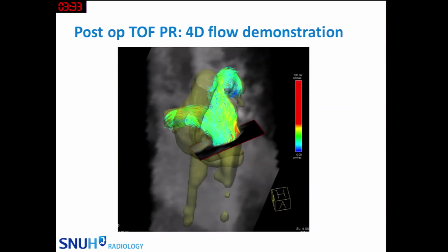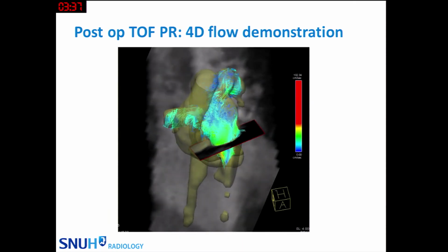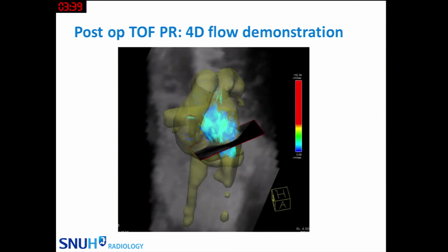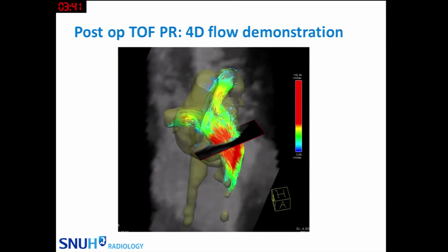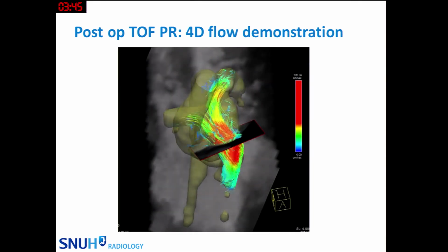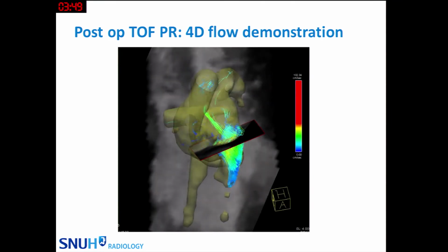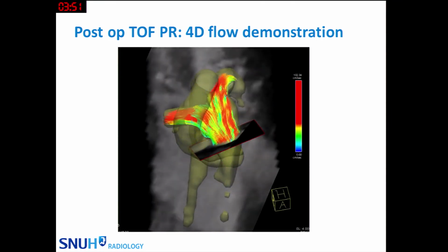This is quite a nice image, but actually very hard to find an application. This is a 4D flow demonstration of the flow. This is actually a 3-view angle of the usual velocity encoding scene, made into a kind of combination.